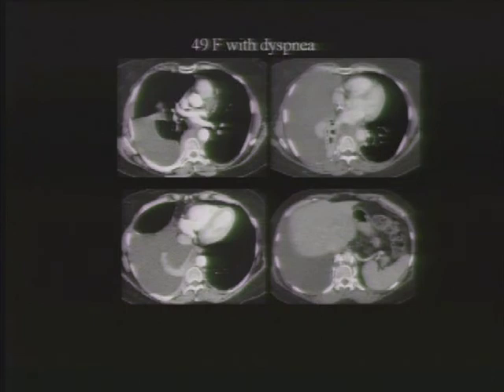One is a malignant effusion due to lymphomatous involvement of the pleura, and the second is a chylous effusion related to obstruction of the thoracic duct by the lymphoma. And hopefully many of you also recognize this high attenuation material in lymph nodes in the posterior mediastinum and a little bit of it leaking into the pleural space, and so this person had a lymphangiogram and actually proved that this was a chylous effusion. But we could have at least predicted that based on the presence of the mediastinal mass.